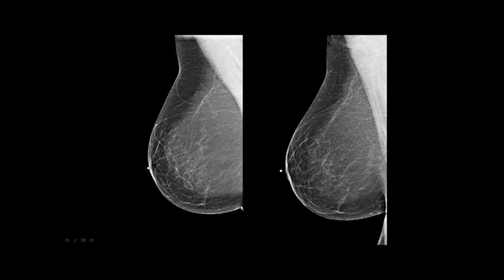Here, it's absent. So we know she's missing posterior tissue on this patient. She's missing a lot of posterior tissue. Plus, the contrast is better over here compared to here. There's probably more compression here. So you could tell that big difference in the positioning, the angle, and the different skills of the patient.